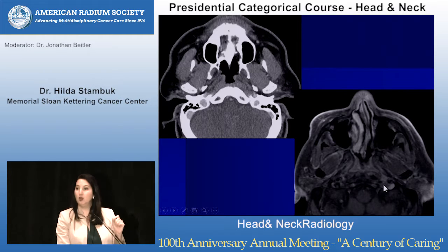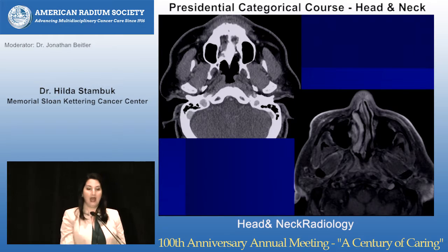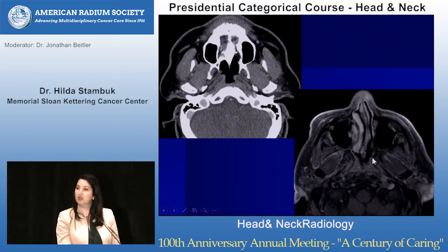The rule of thumb for mucosa in the oropharynx, nasopharynx, and hypopharynx is you should be able to take a sharpened pencil lead and draw the enhancing mucosa, because mucosa should enhance. So let's look at the left side. Nice mucosa, nice thin uniform fossa of Rosenmuller going to the back. This is way too thick. Granted, it's a small tumor, but it's a definite tumor. They took this patient to the OR, did a biopsy, and they found that's where the primary site was.